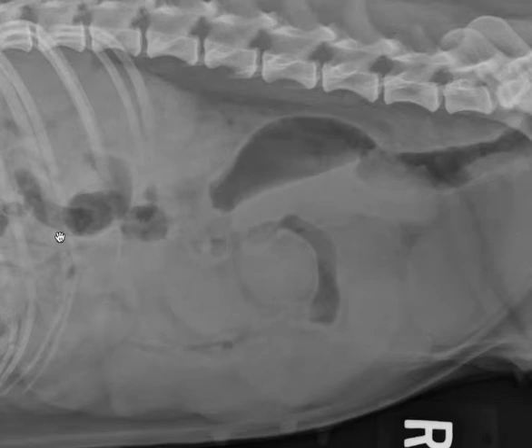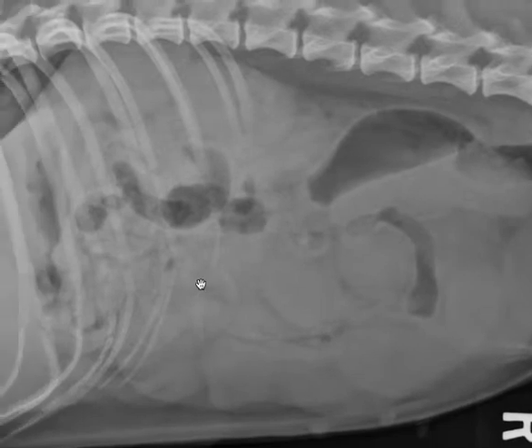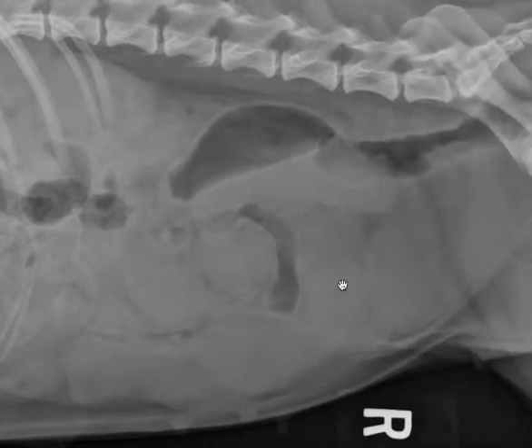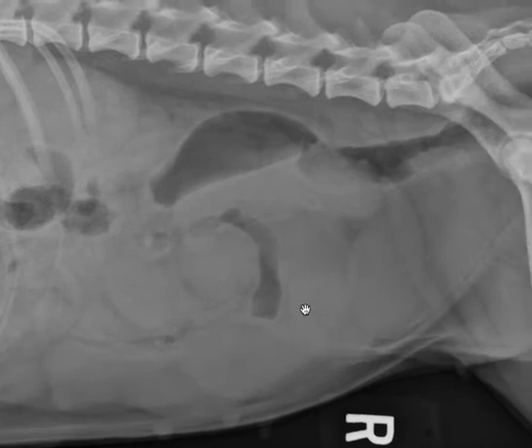As I go through the lateral radiograph on our little Boston Terrier today, of course, with small intestine in mind, I can see lots of regions where there's gas that's clearly either small or large intestine, some segments here that clearly represent small intestine based on their size and position. As I come more towards the caudal abdominal quadrant, I'm seeing very enlarged, distended, almost sausage-like tubular structures. I can kind of get the impression that these join, but they're difficult to trace.